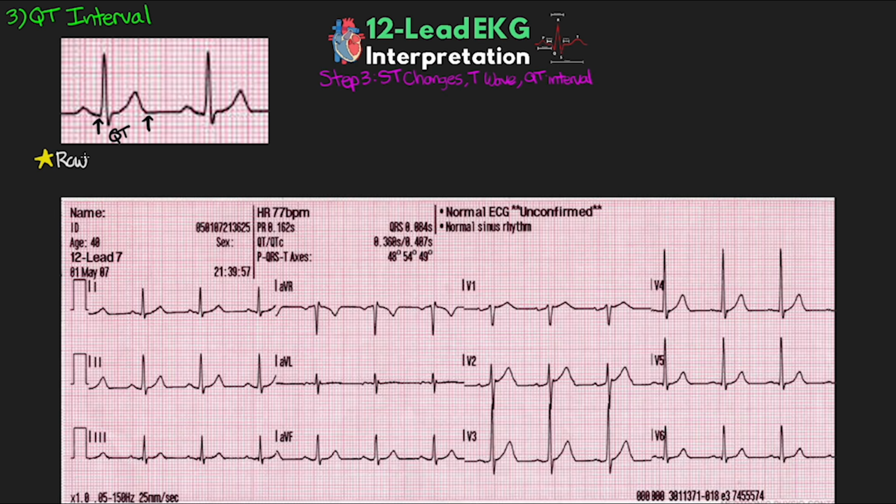This raw measurement, though, doesn't actually tell us a lot, as our patient's QT interval is often going to change based on their heart rate. So faster heart rates are going to have shorter QT intervals, and so really what we need to do is correct the QT interval for the heart rate, something that we refer to as QTC or QT corrected. This is done in a few different ways, and as we can see here, the EKG actually does the calculation for us as well.